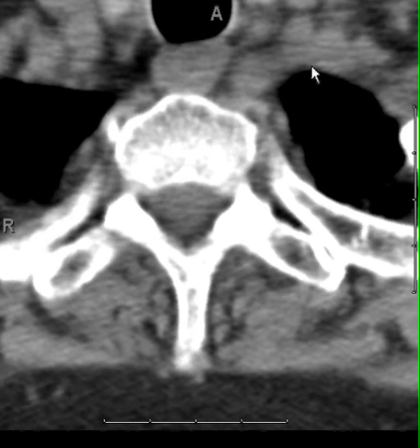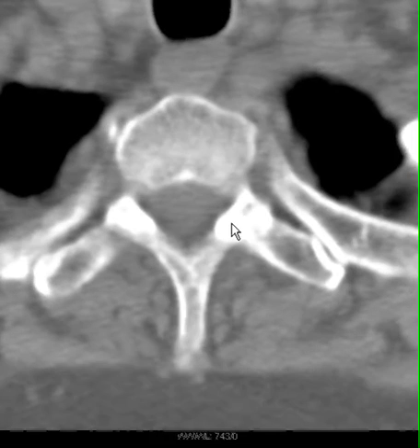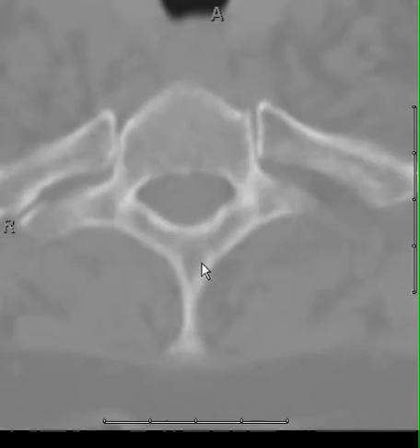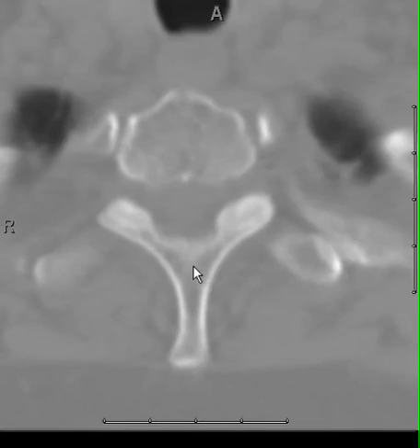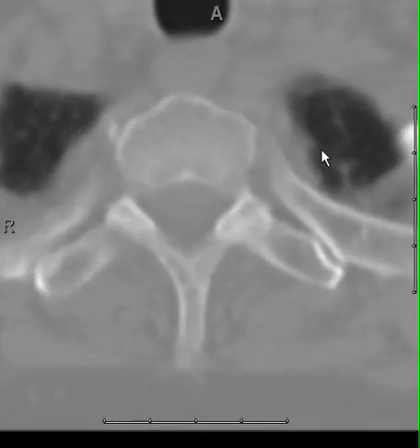We do get a crack at the lung apices, which are probably better seen on the bone reconstructions, but one more chance to find some pathology. Many times you will see the tippy top of a pneumothorax in a trauma patient.